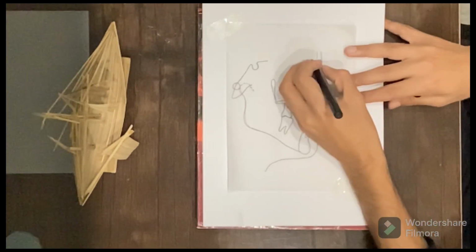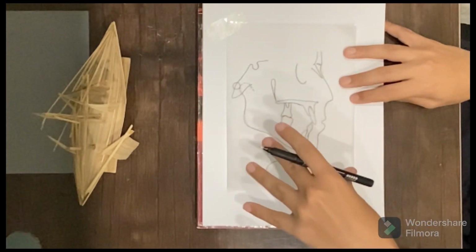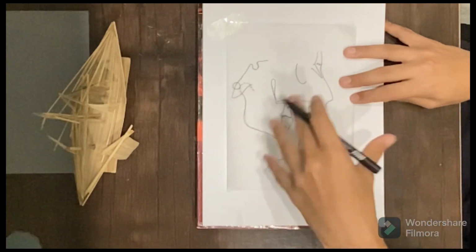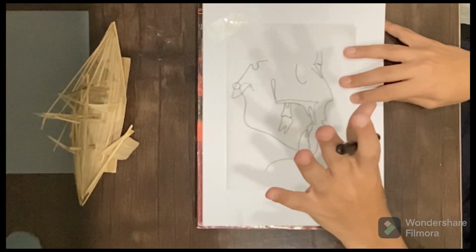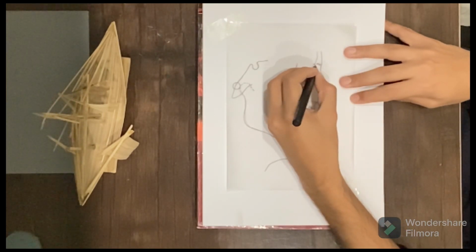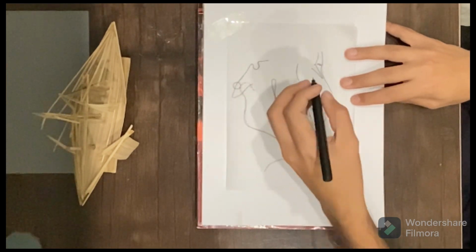The first unilateral landmark is nasion. I am tracing it with the help of a pointer, but you should trace it with a pencil, never with the pointer. I am doing it to make it more presentable so that you can easily see it, but it is usually done with a pencil. So this is nasion. Nasion is basically at the intersection of the frontal bone and the nasal bone. This one is the nasal bone, this one is the frontal bone, and this intersection point is the nasion.